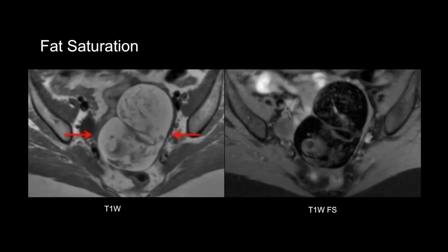Let's talk about fat saturation. So, fat is bright on images derived from T1 weighted images and fast T2 weighted sequences, as mentioned earlier. We often suppress the signal from fat for a few reasons, and we can do so in a few different ways. MRI is a little bit different than CT in how it displays signal intensities.